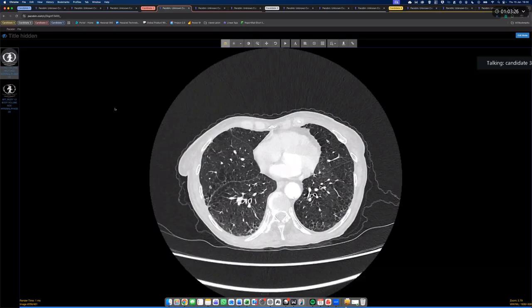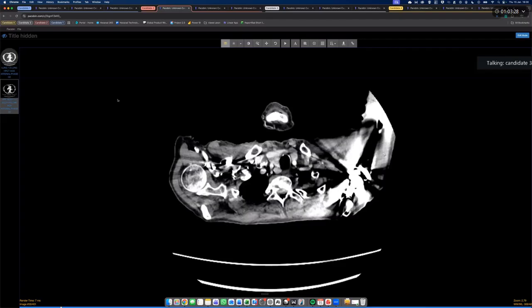There are predominant emphysematous changes in the upper lobes and predominant fibrosis in the lower lobes. To summarize, on the lung window images there are emphysematous changes in the upper lobe and usual interstitial pulmonary fibrotic changes in the lower lobe, which could be a combined pulmonary fibrosis and emphysema disease.